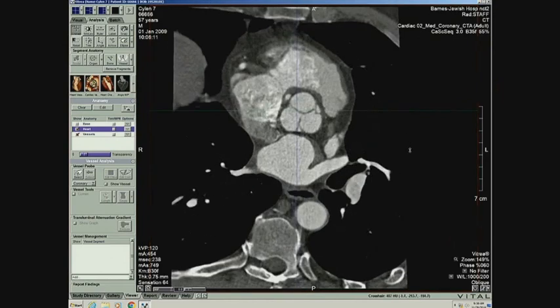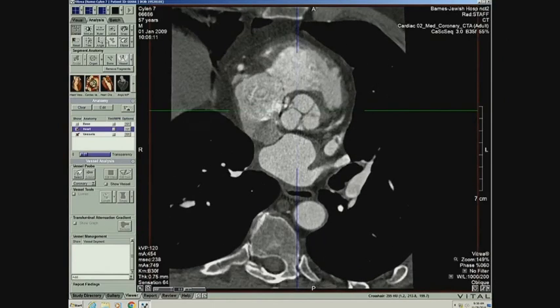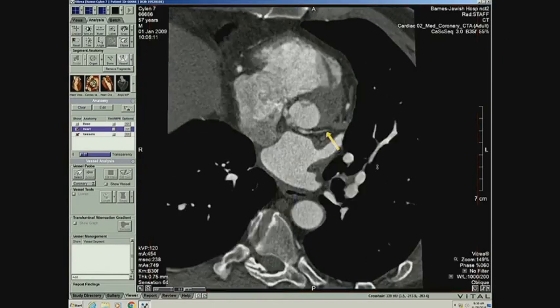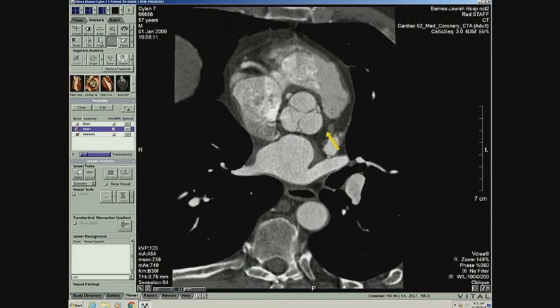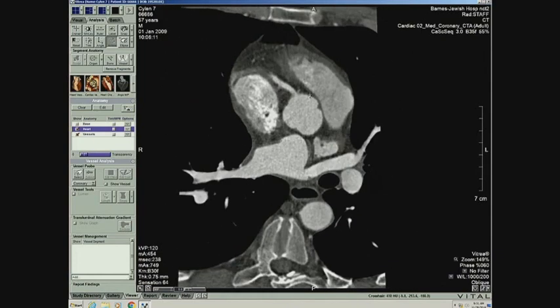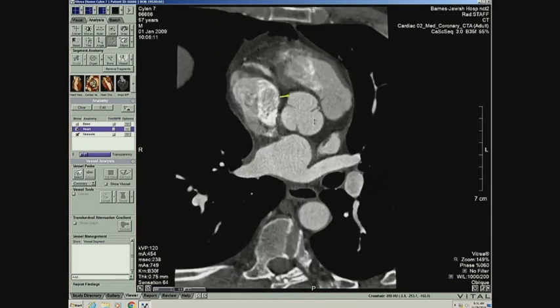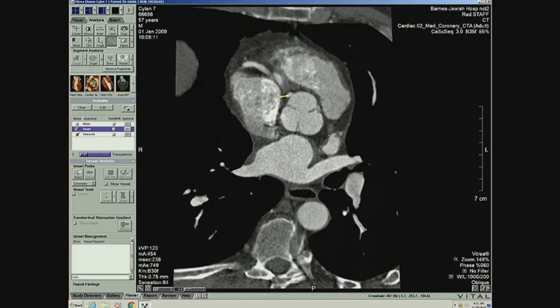Starting from the left sinus, do we see anything coming off of it? There's a vessel close to it, but it's not coming off. This guy here, we can follow it. It travels between the atria and the aortic root, really low down. I'm now below the level of the sinuses. Some atherosclerotic disease there. And then it comes off here, off that right sinus, right over here, with a separate origin from the RCA.